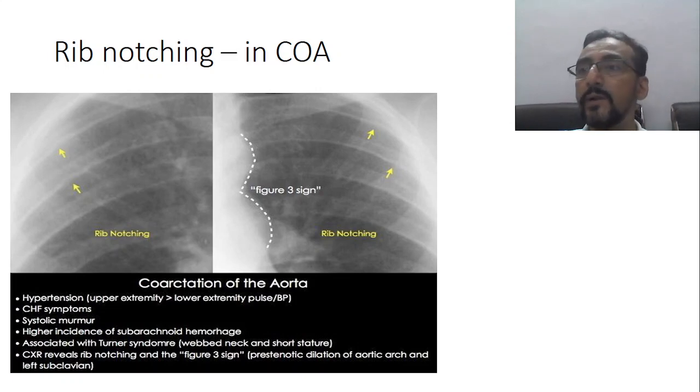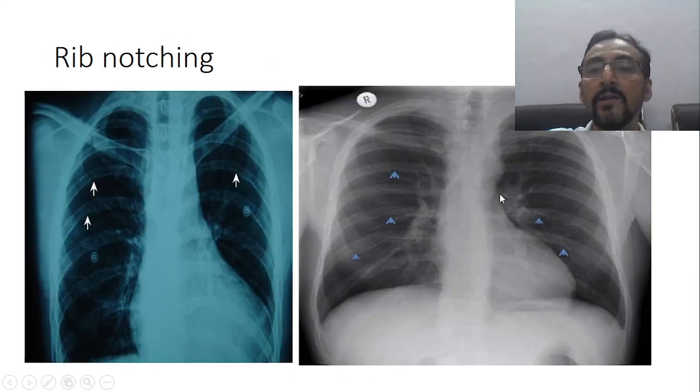Aorta, we know that in the X-ray, if you go for the X-ray, this particular portion, the aortic knuckle will be present, isn't it? So I am using this X-ray, okay, second X-ray. So the aortic knuckle will be present over here. This is the normal aortic knuckle. Okay, after the aortic knuckle there is a window, the aortopulmonary window, and after the window your left atrial appendage starts, then the left atrium and then the left ventricle.